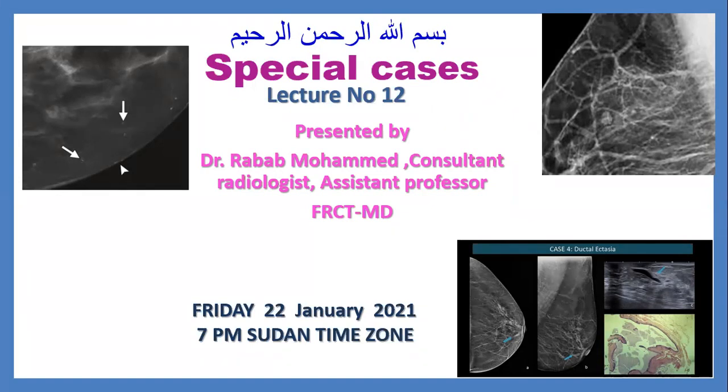Single dilated duct. You can see it. You will understand if you look at the mammography presented here. You'll understand which is the third one. You mentioned for me intramammary lymph node and single dilated duct, ductectasia. Yes, single dilated duct, intramammary lymph node.